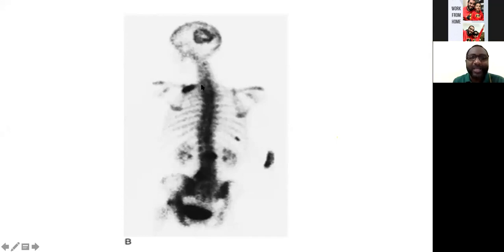Again, in this patient, you can see that there's a mixed lesion. There's a single cold lesion with a ring of increased osteoblastic activity. But you can see also that there's a linear uptake in the posterior first rib and the other rib on the side. So this patient has multiple skeletal metastasis, but what is of interest here is this osteolytic activity. Now remember again at this point, like I mentioned earlier, that bone scan ability to pick lytic lesions is usually very poor. So each time we are putting a report, if we say that there is no evidence of skeletal metastasis, we usually will want to put a caveat that a bone scan has less sensitivity for osteolytic lesions, but it has very high sensitivity to osteoblastic lesions. So put that in mind.